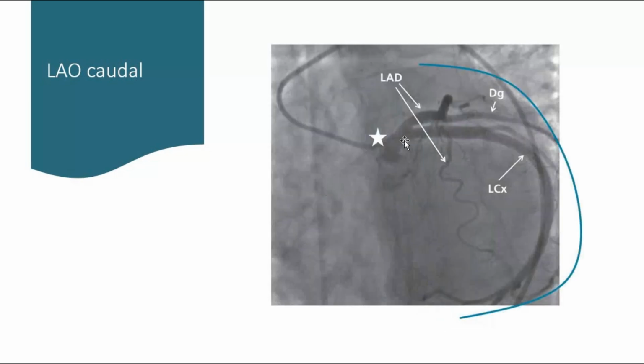Here's a real picture of it. The left circ is focused in front of you. The LAD goes that way, and the diag goes down, goes to the right, like this way.